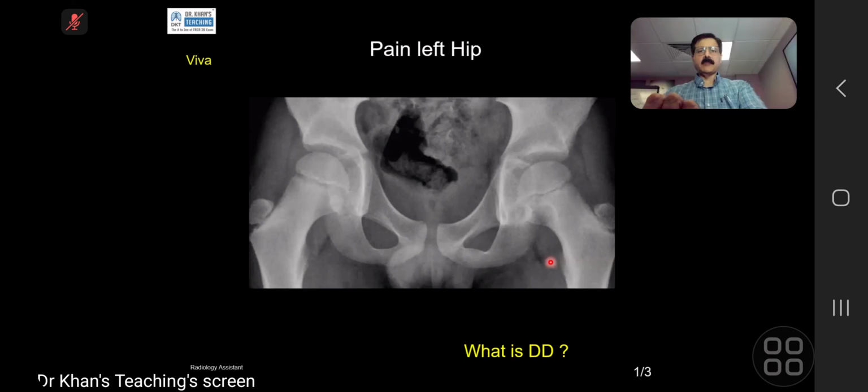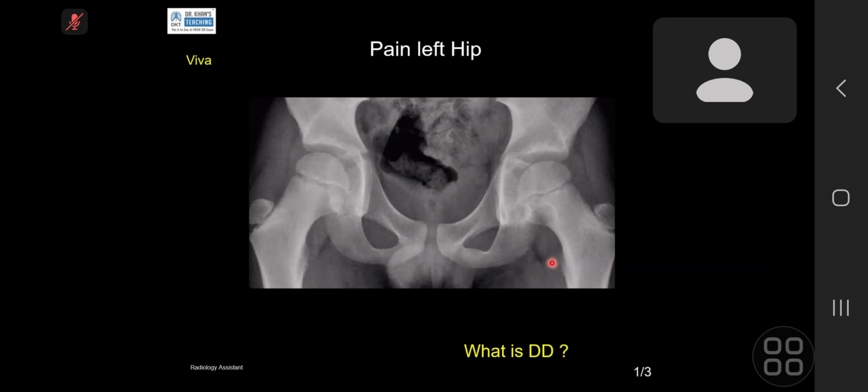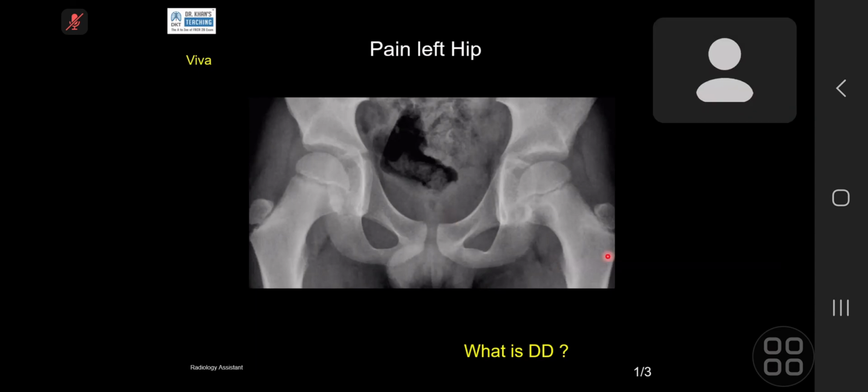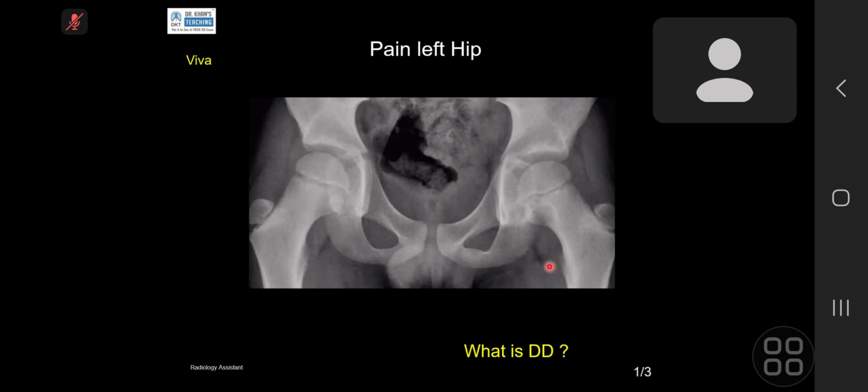This patient has got pain. And I would also consider an infective cause for such a lesion. Look at the capsular fat plane. Compare this with this. What do you think? It appears displaced. And this is the iliopsoas fat plane. What do you think? It does possibly represent an element of effusion adjacent to that lesion. So I would also consider an osteomyelitis.